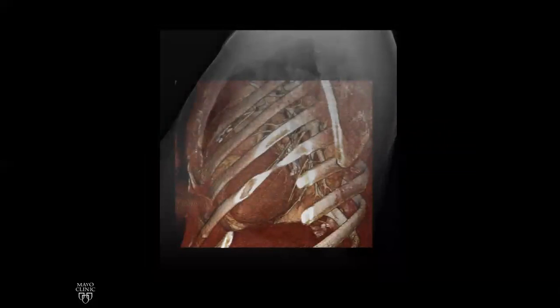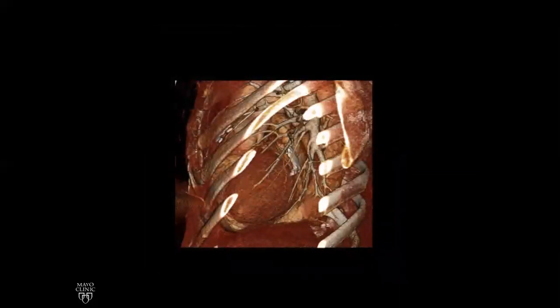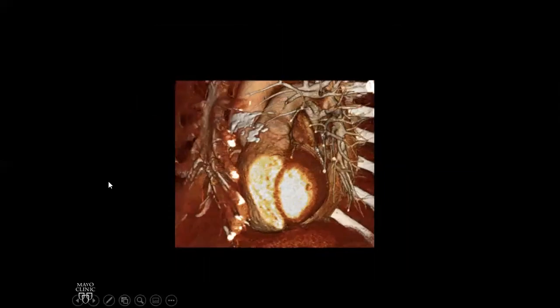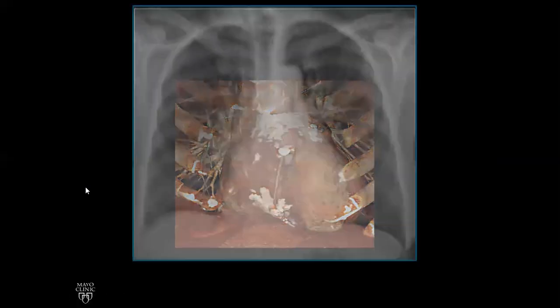If we go to the CT scan, you can see these calcifications are sitting out here over the ascending aorta, over the lateral wall of the left ventricle. This is pericardial calcification. Oops, that was too fast. Sorry, we've got to do the full rotation here. It's over the ascending aorta, over the right atrioventricular groove, over the RV outflow. So this is pericardial calcification.